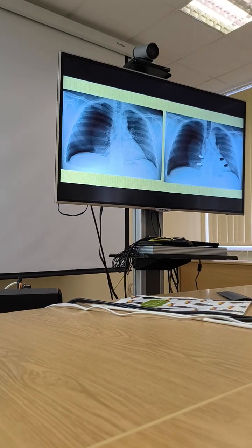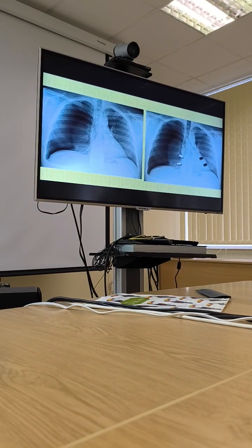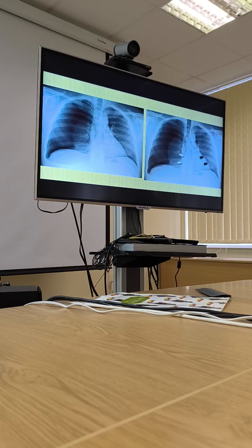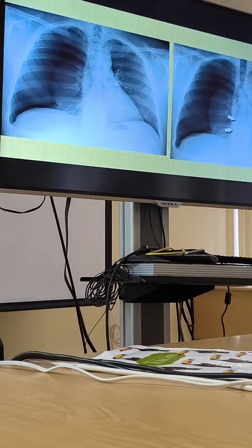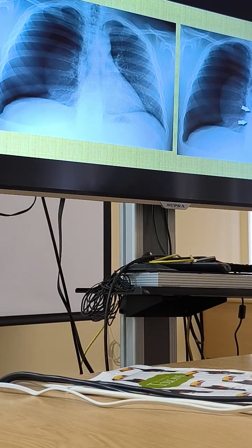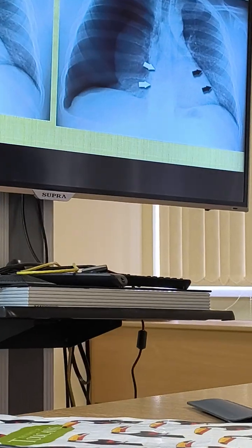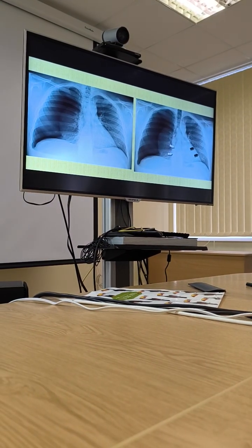Let's see this last picture in this section. So, what is an elephant there? Well, sometimes it's less obvious and it's kind of tricky, but it also works. Displaced. So if we think this can be an elephant, that will be our root. We should figure out what's wrong. What does it mean? That means that there are some volume changes.